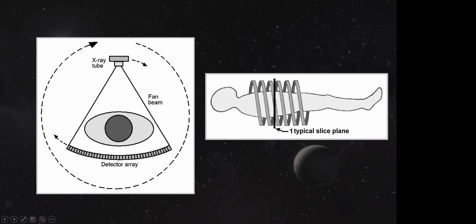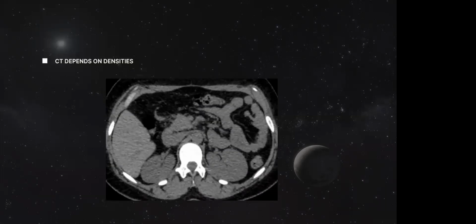and densities. Now, images in the CT depend upon density, contrary to the MRI, in which every organ gives back its own signals. The image in the CT depends upon the different density of the different tissues, how much they absorb the X-ray and how much they allow to pass. In the body, the different soft tissues really don't differ much in their respective densities, so we are unable to identify different structures if we use it without contrast.